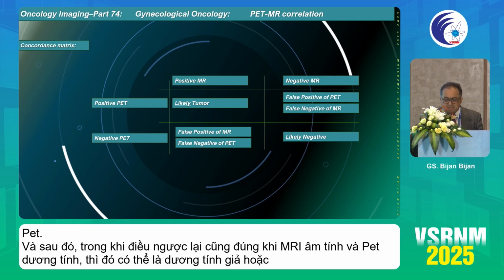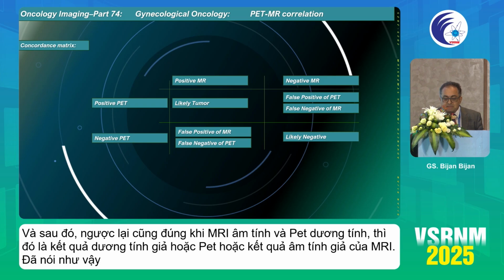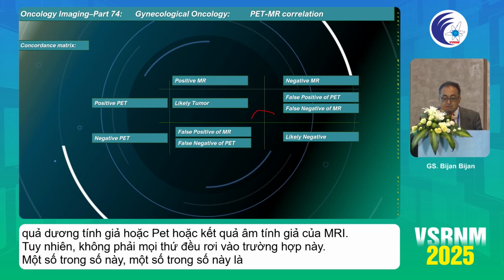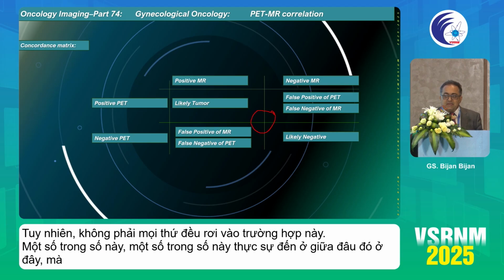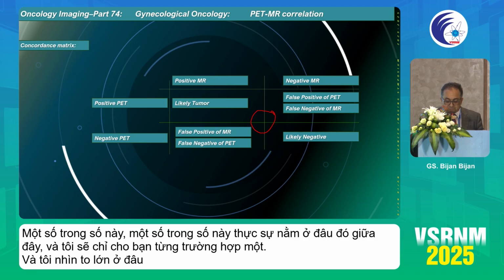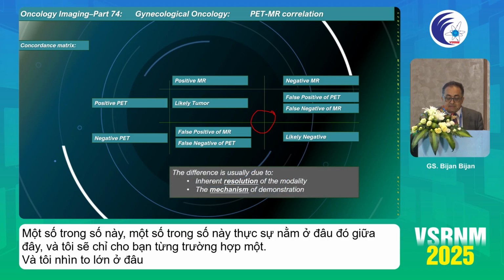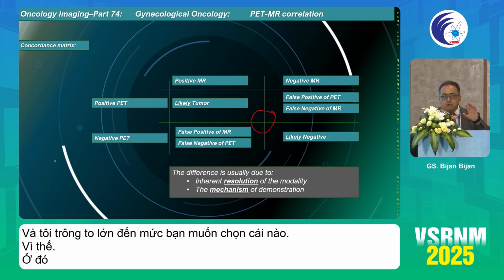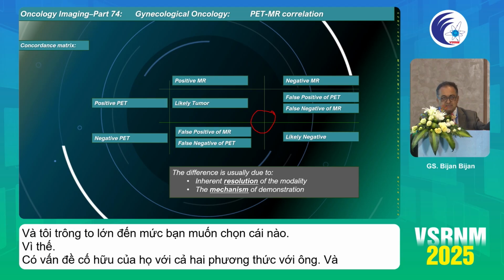Now, not everything falls into these categories. Some of these are actually right in the middle, somewhere here, and I'm going to show you cases, case after case, and let you judge which one you're going to go for. There are inherent problems with both modalities, MR and PET. Both of them are excellent, but there are also shortcomings.